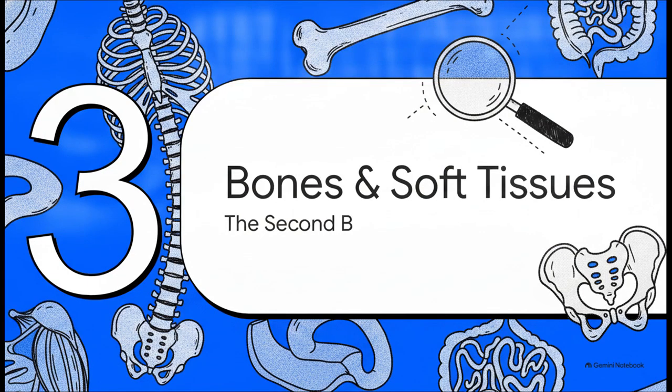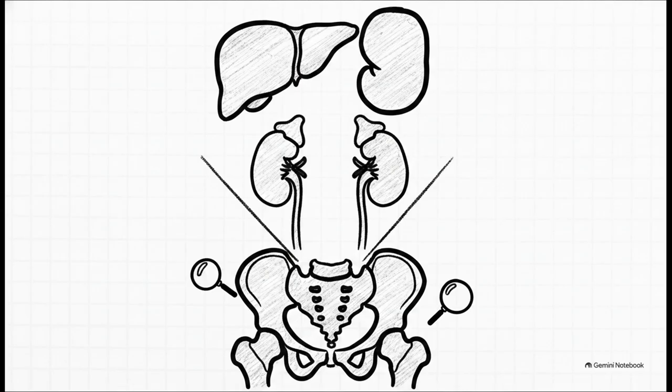Let's shift gears to step 3. Bones and soft tissues, the second B. Now we're shifting our detective lens entirely away from the bowel to investigate the solid structures. We must trace the solid organs, check the skeletal structures for fractures or metastases, and ensure the psoas margins aren't blurred. Start by inspecting the silhouettes of the liver and spleen for organomegaly.